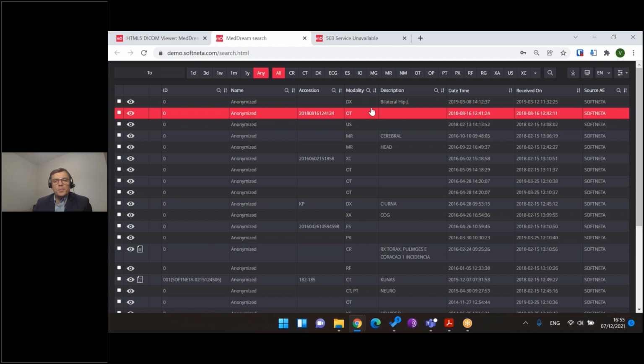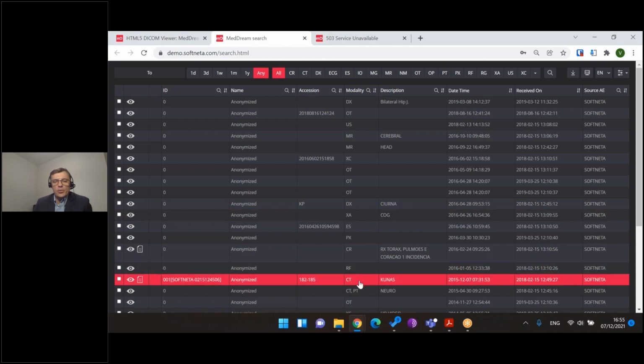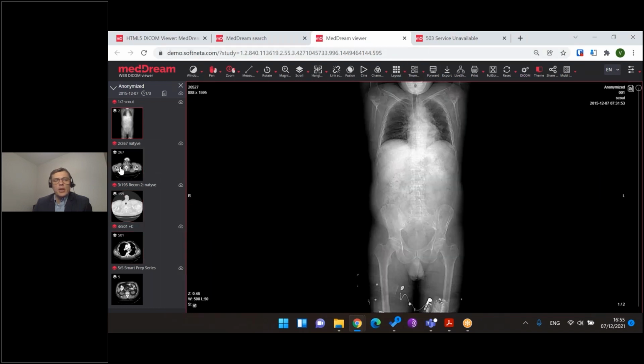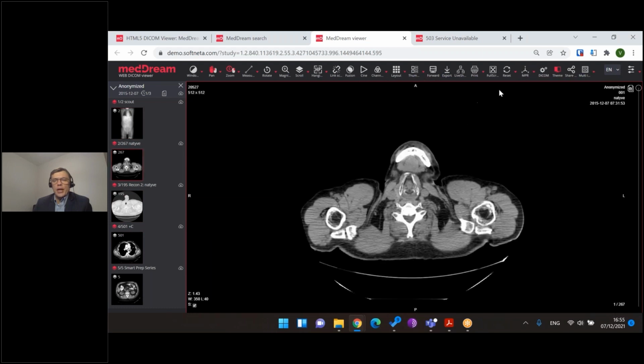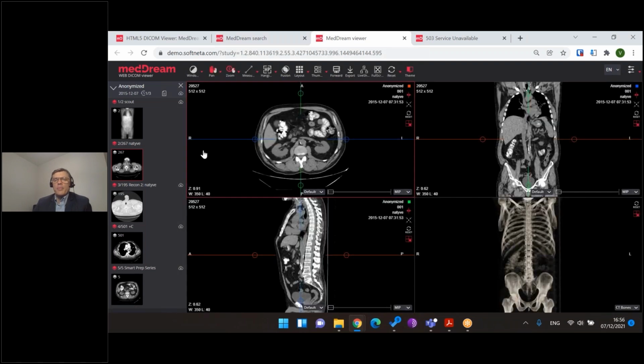Yes, let's go now to see copy to clipboard image. So we could open CT to see also the new MPR functions. So I'm selecting now any study which I would like to create MPR. I need to check the MPR functionality, and as you see, the new oblique MIP function became available. So when you click oblique MIP function, the system preloads the data to your computer. As you see, the red line is progressing. And now we have an MPR available.